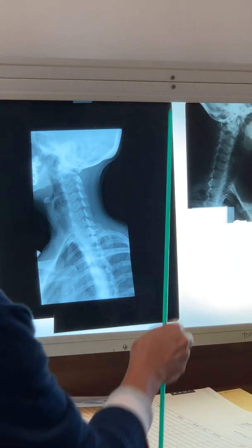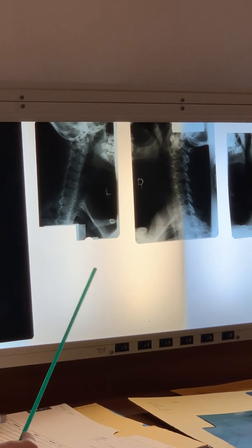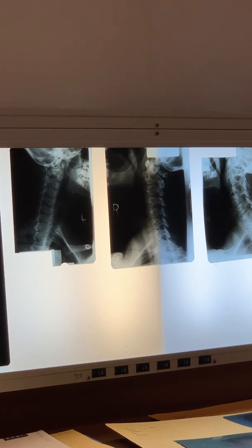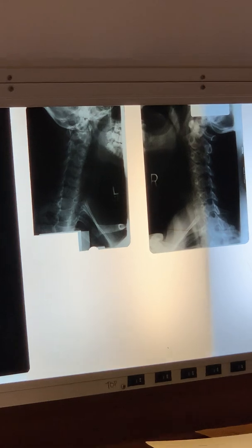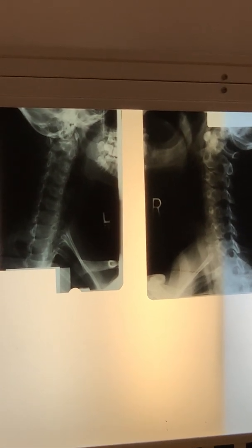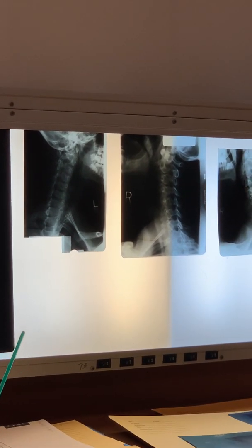Okay, so we said this is an LPO opening up the right intervertebral foramen. If you were to critique these two, what would you say? They're a little dark. So what do we call that? Too much what? KVP? Contrast? It's overexposed, or too much receptor exposure is what they use now, not too much density. They take the density away. So these have a lot of receptor exposure.